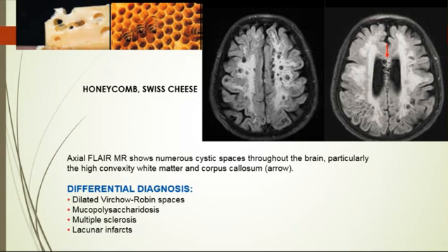In the susceptibility weighted imaging, you will see microhemorrhages. You see the microhemorrhages. Okay. So, these are the Virchow-Robin spaces or the perivascular spaces. They contain interstitial fluid surrounding the vessels, and they occur from the subarachnoid space to the brain parenchyma. So the small Virchow-Robin spaces are normally seen at imaging, increasing in size and number with advancing age.